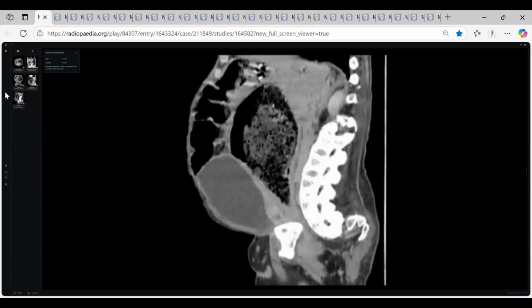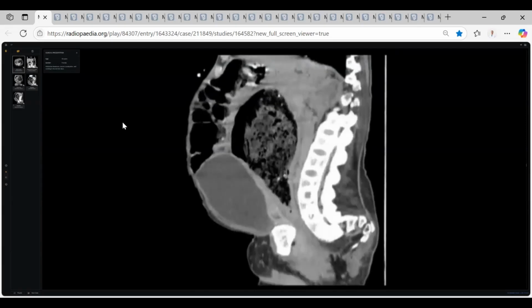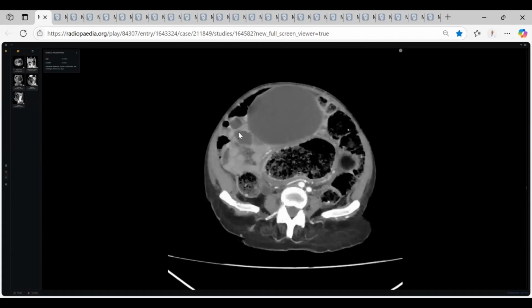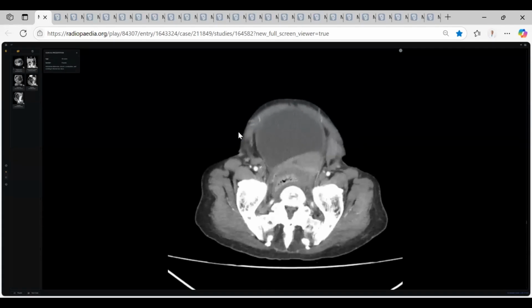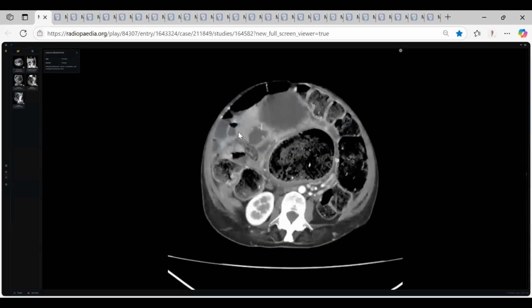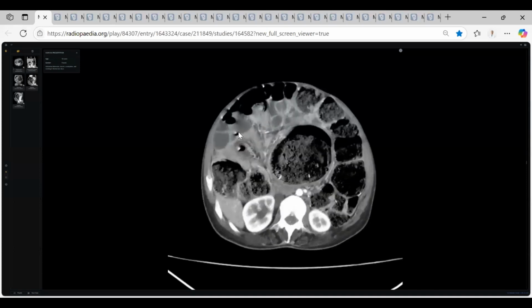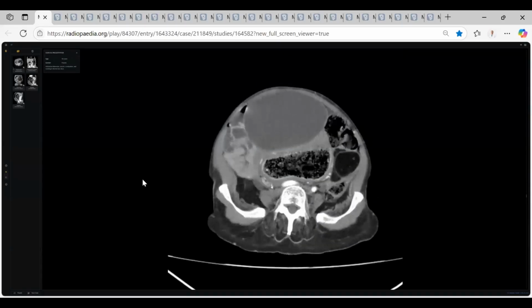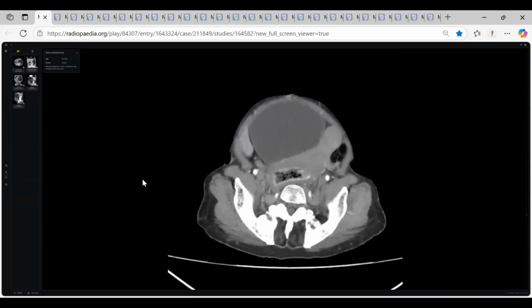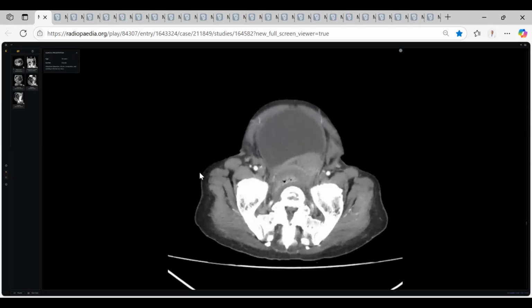Okay. What happened here? Markedly dilated. You did very well until before the end. Markedly dilated, and then a caliber change. Here, see, all the bowel, not only the colon. I think you can't even differentiate where the small bowel is. I think this is maybe the small bowel. Markedly dilated colon loaded by feces, and then here there are significant caliber changes.